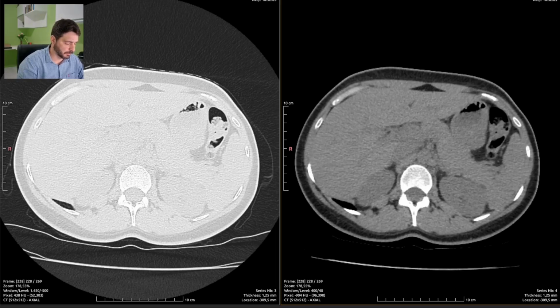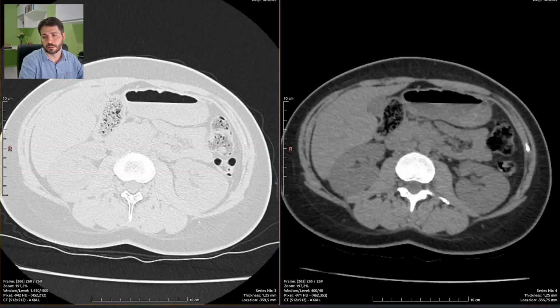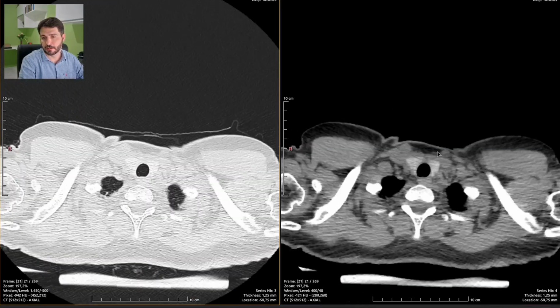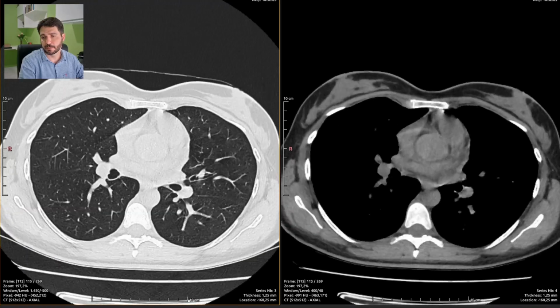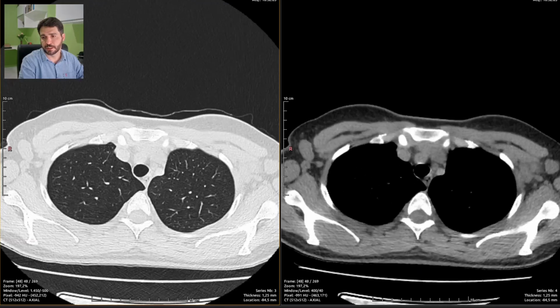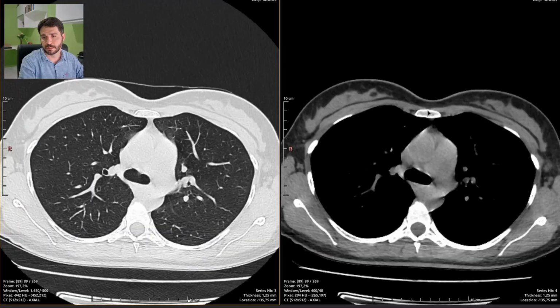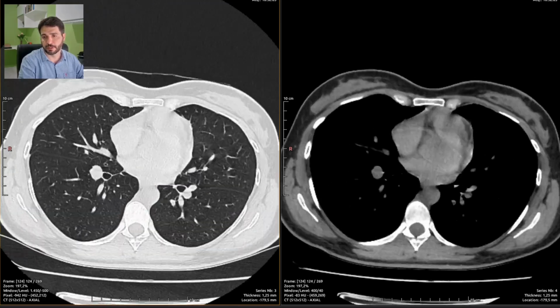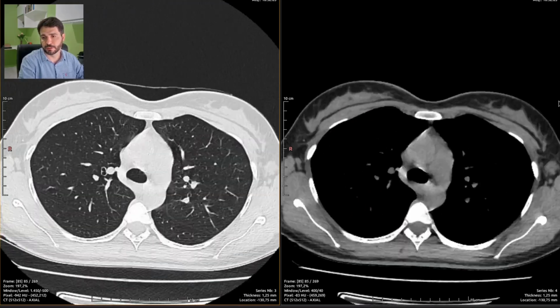So we don't actually know why the patient is doing a chest CT scan just for cough, so that might be something else. The thyroid gland is fine, even though there is adenopathy outside the chest. There is no such disease inside the chest, on the mediastinal nor the hila, the pulmonary pedicles.